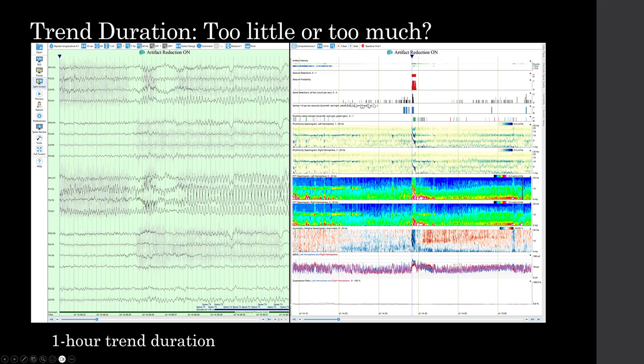For instance, we have an increase in spike detections leading up to the seizure that we can see in the trend below the seizure probability. And in the rhythmicity spectrogram, we can see that pattern that's typical of this particular seizure morphology. We've got something going faster to slower, starting at the upper part of that trend display and angling downward. That means we have a pattern that's rhythmic or periodic that's going faster to slower. It's evolving. And so by having both the detections and the trend panel duration set to where we can see those patterns in the trends, that helps increase our yield of recognized seizures.